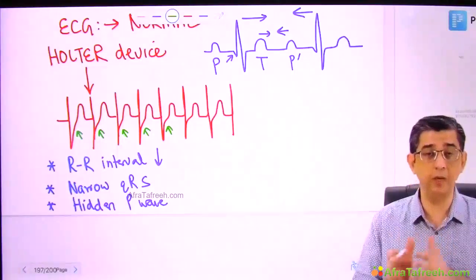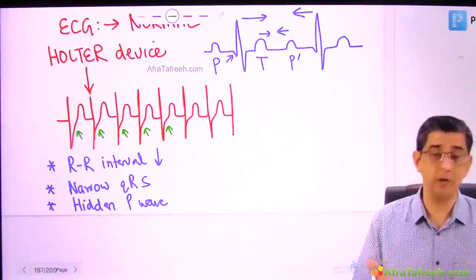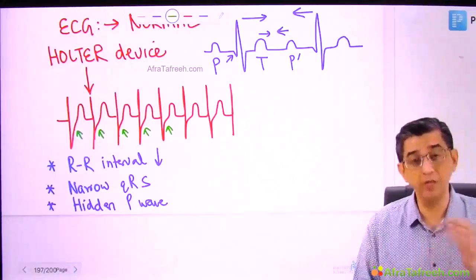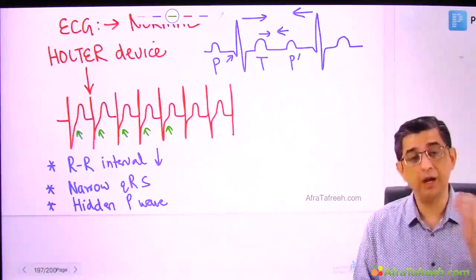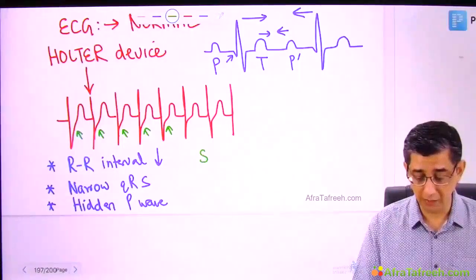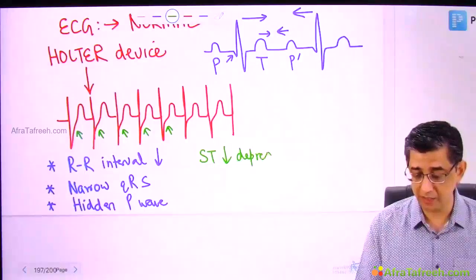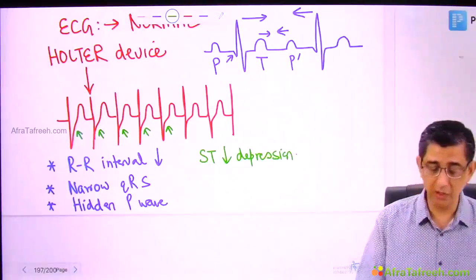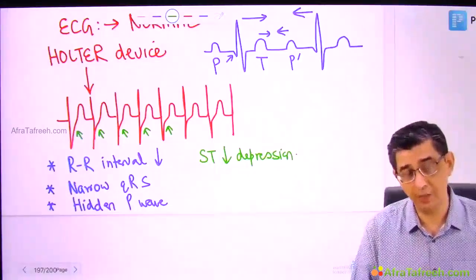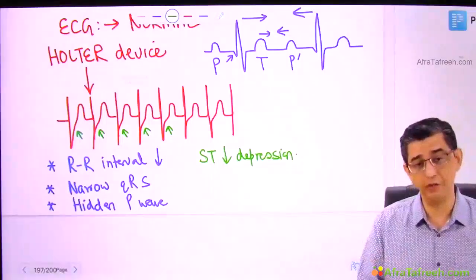I mean, there's a limited amount of oxygen available via the patent coronary arteries of the patient, and the demand is tremendously more. So because of the mismatch between the demand and the supply, there can definitely be some magnitude of ST segment depression present in a lot of ECGs of PSVT/AVRT. The green is representing the global ST segment depression. What I mean by global is it could be present all over, that is, all the 12 leads of the ECG.